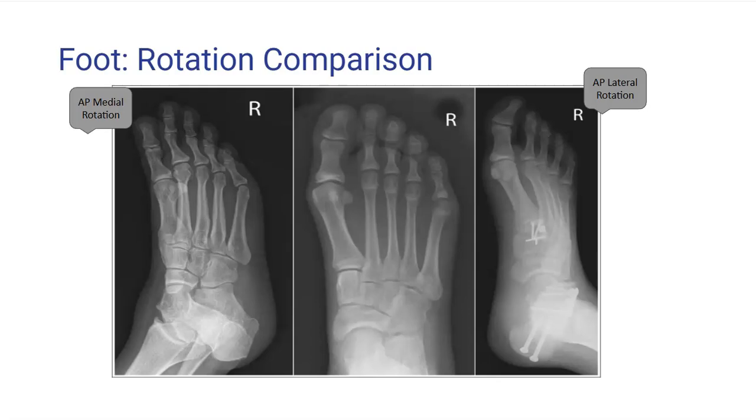However, if the foot is improperly aligned, rotation can occur. In lateral rotation of the foot, there will be an increased superimposition of the metatarsal bases, closure of the medial and intermediate cuneiform joints, and the talus moves over the calcaneus, causing more than 1/3 of the talus to be superimposed by the calcaneus.